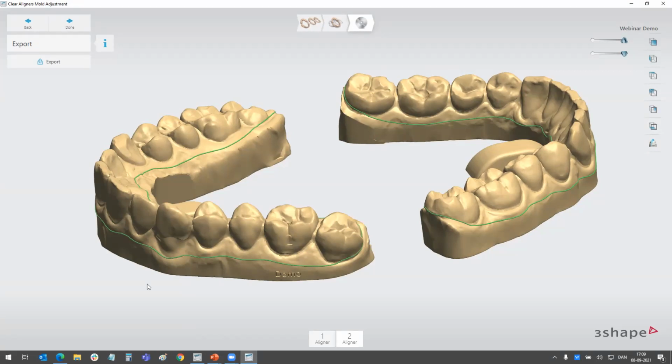There is something we need to be aware of when it comes to analysis and questionnaires. This new auto segmentation is an entirely new format, and it's not yet compatible with all of the analysis and questionnaires. So for some of them, you would be asked to do manual segmentation for them to work together with the auto segmentation.